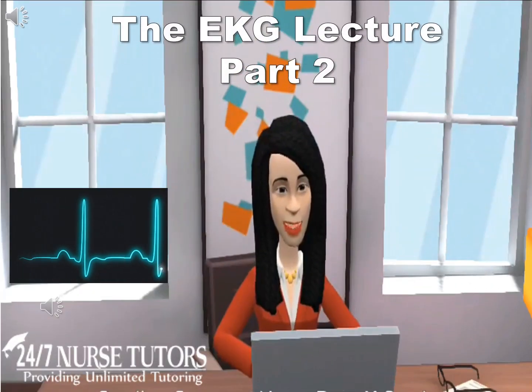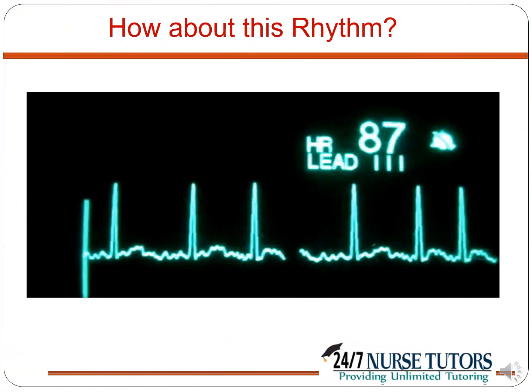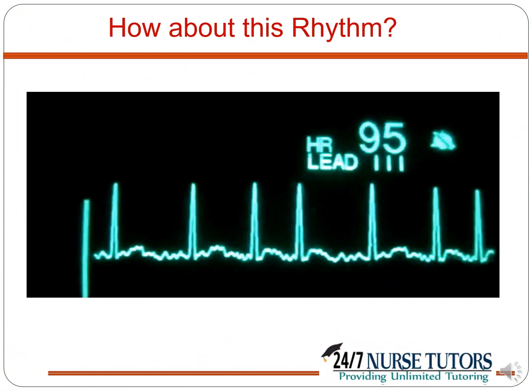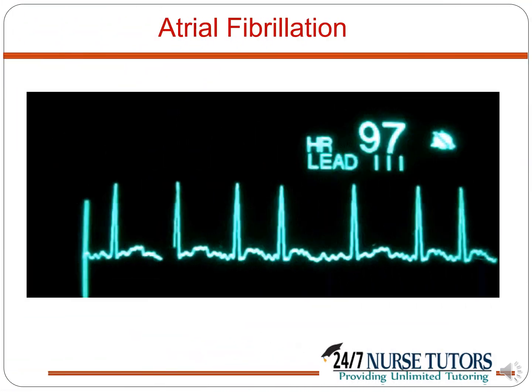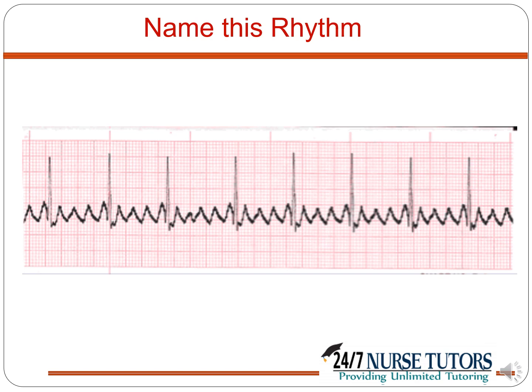The EKG lecture. Part 2. Can you please tell me what this rhythm is? This is atrial fibrillation. Can you please tell me what this rhythm is? This is atrial flutter.